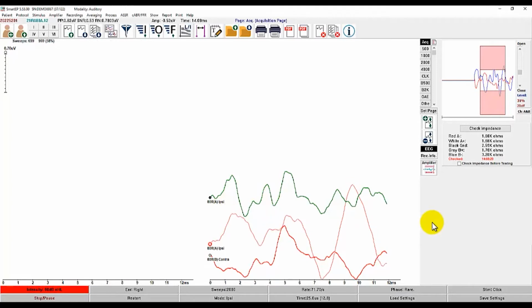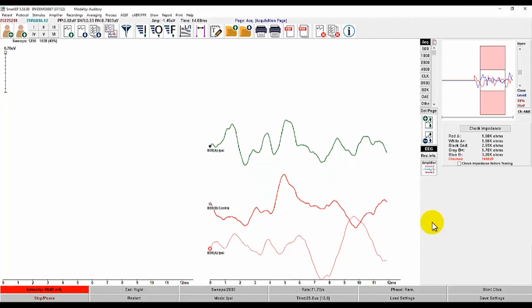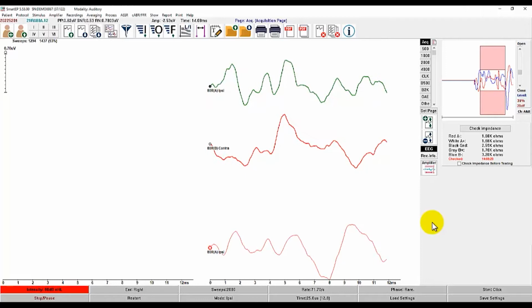To move both of these recordings together, I will hold down the Control key and use the arrow up and arrow down keys to move both recordings together. This also works if you manually selected more than 2 recordings and makes moving multiple recordings up and down the screen faster. Holding down the Control key while moving the recordings with the mouse also works.